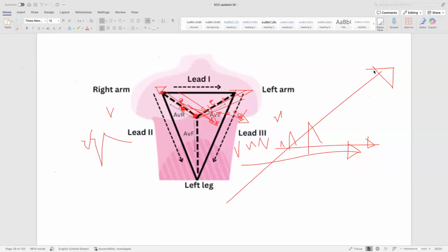If it's not progressing very well, that means it is negative, negative, biphasic, small, and keeps small, not massive. What is the significance? What are your suspicions or differentials?